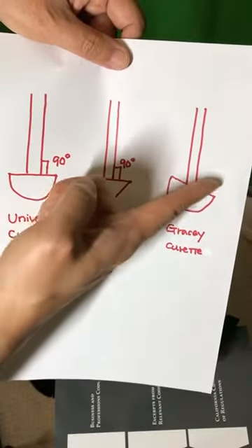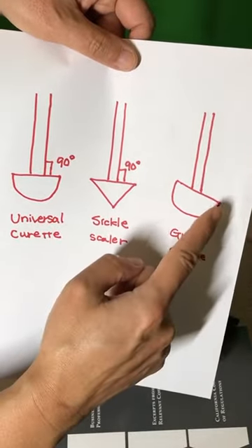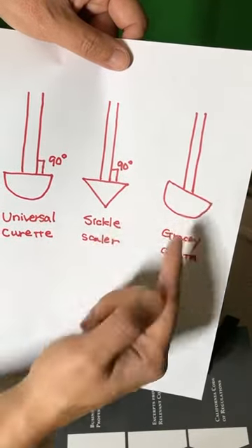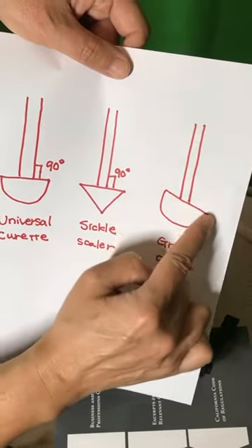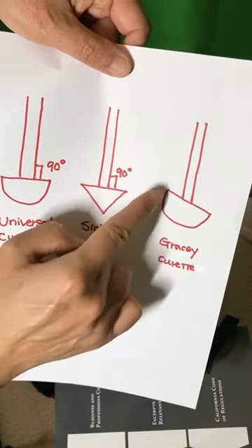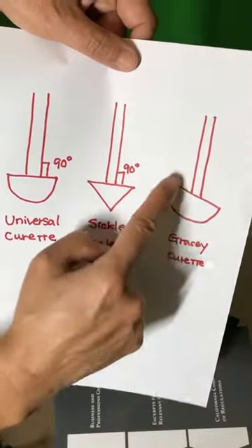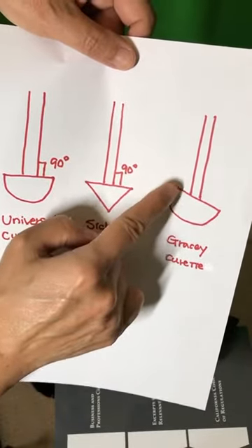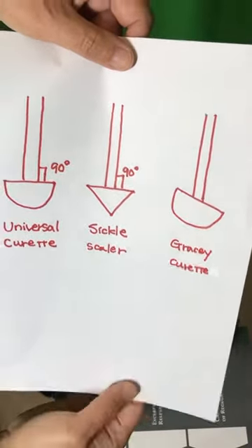But here, the Gracie curette or some other innovative instruments came out where the terminal shank is not necessarily at a 90-degree angle to the face of the blade. Then usually the lower cutting edge is the one you use: when you look at the terminal shank and the face, the more slanted side is the cutting edge you use. Usually the non-cutting edge is not sharpened for Gracies, but with some of the newest innovative instruments both cutting edges may be sharpened, but I don't know how you can use the other end much. At this end, the lower cutting edge is the one to use.